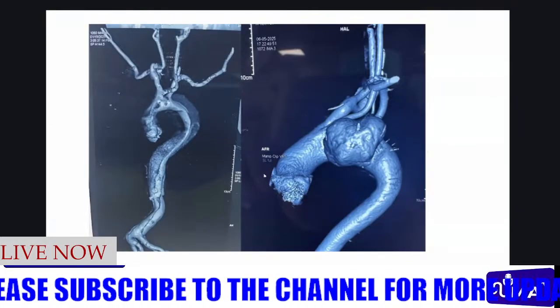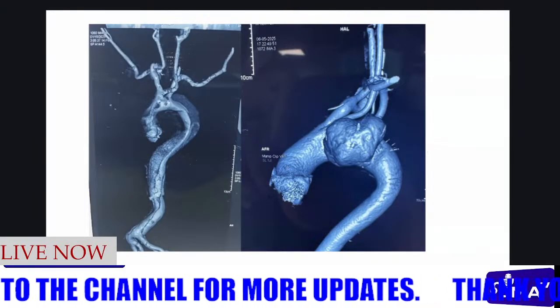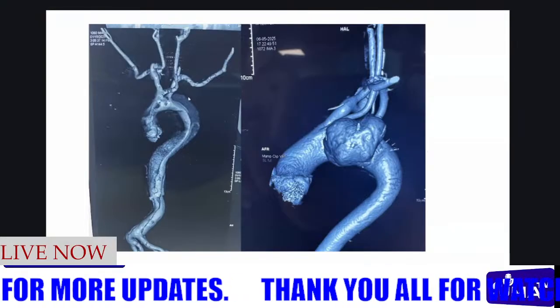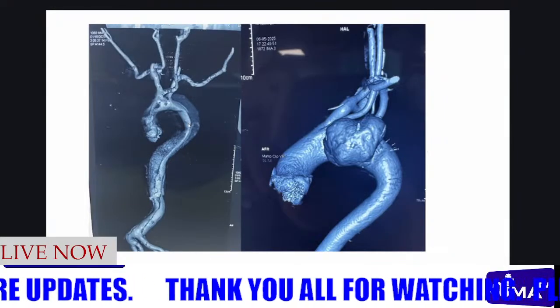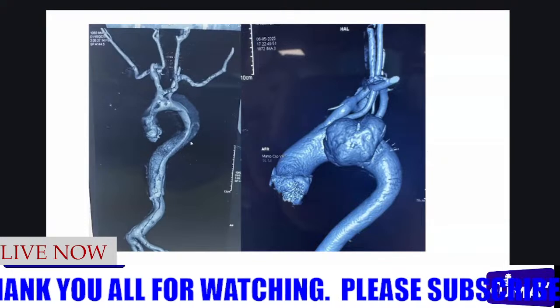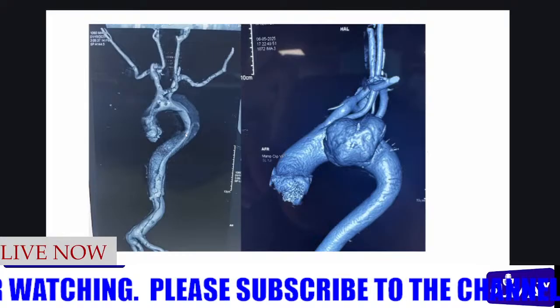So these are some of the patients we operated while I was in my training center in India. This was a Ugandan female who found us in that hospital. And you can see this patient has barely any true lumen, so small.